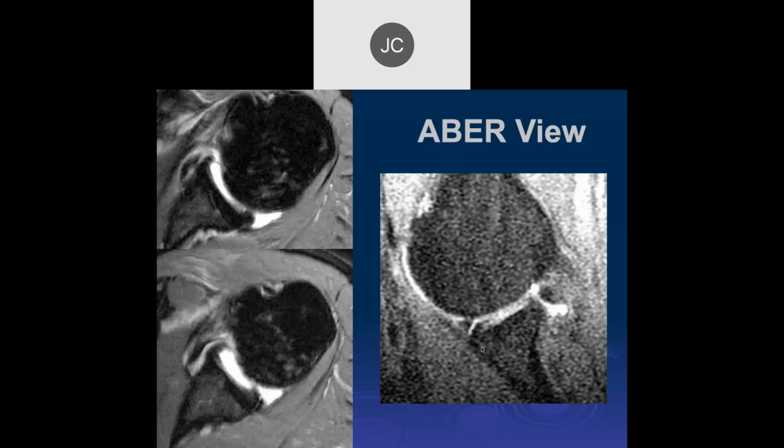We did a series of about 200 of these, comparing them, and it turned out that it actually obscured more labral tears than it helped. Because if you put tension on this anterior capsule, in some people it will pull the labrum back to its base again and actually obscure the labral tear. So you can have it really go both ways. That's why you have to look at both.